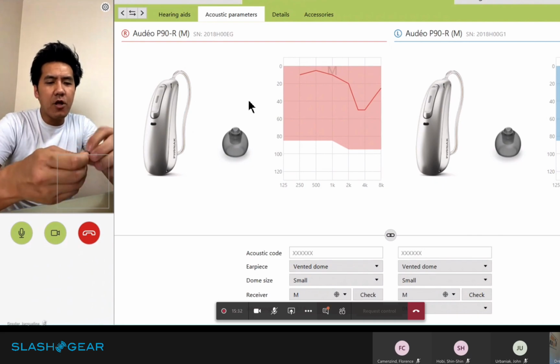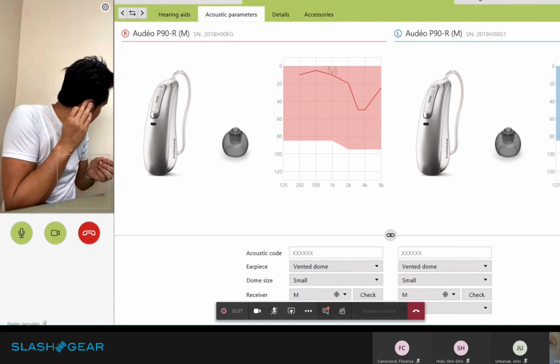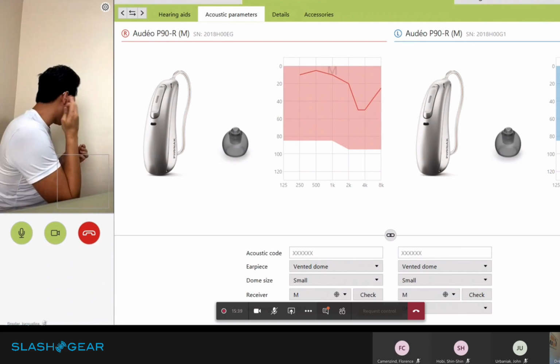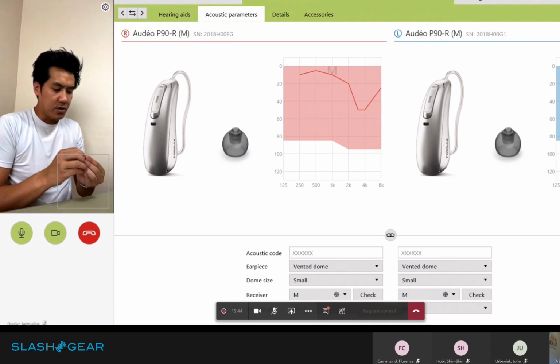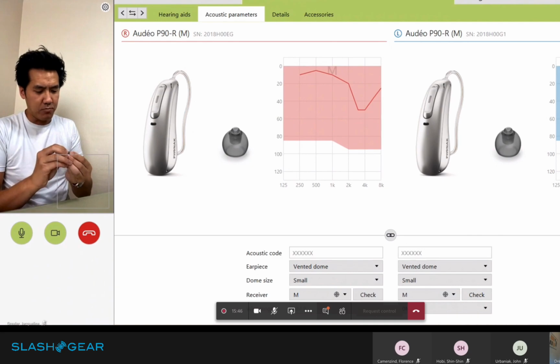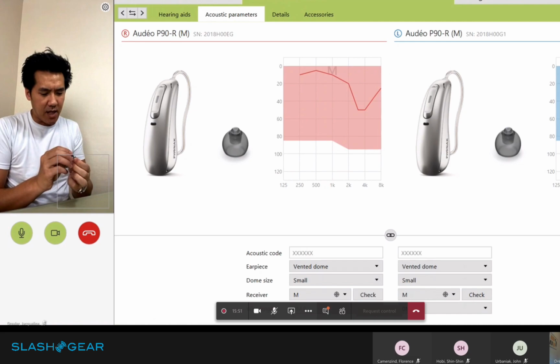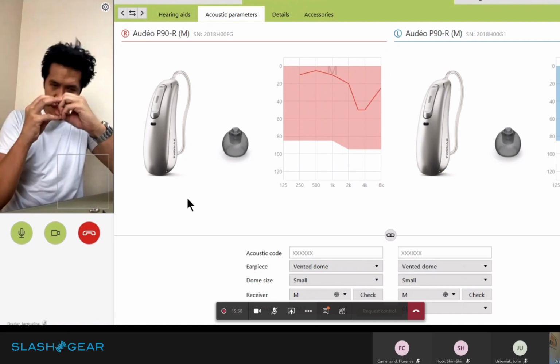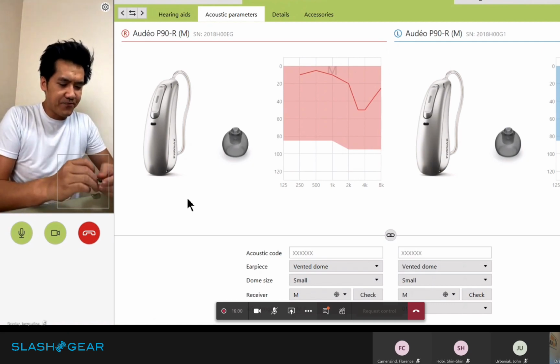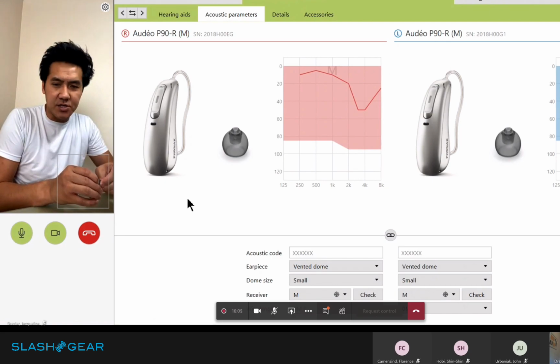They start off fitting well in the ear. So as you can see, the placement of the hearing aids in relation to how they fit in my ear is perfect. But then when I start moving around and getting active, they tend to slide around in it. It's kind of like pressure, so it kind of pushes out as I move around. So I'm not sure if it's because it's too big and it's doing that.